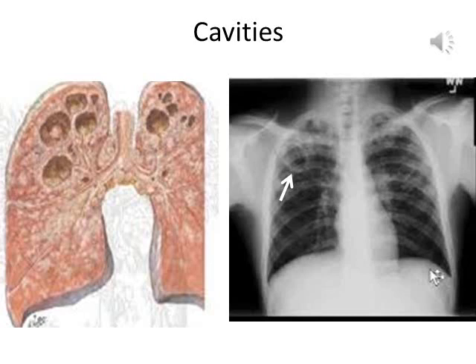This picture on the right shows an X-ray with a thick-walled cavity in the right upper lobe of the lung. The illustration on the left shows a cartoon of the lung with cavities produced due to the tissue destruction caused by Mycobacterium tuberculosis. The presence of cavities supports a diagnosis of TB. However, atypical mycobacteria can also present with a similar radiological picture.